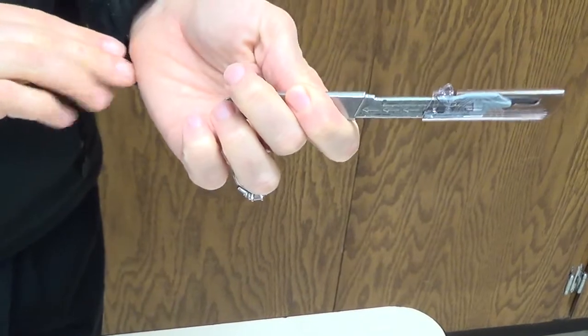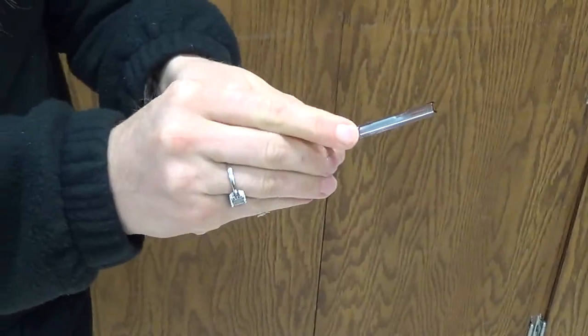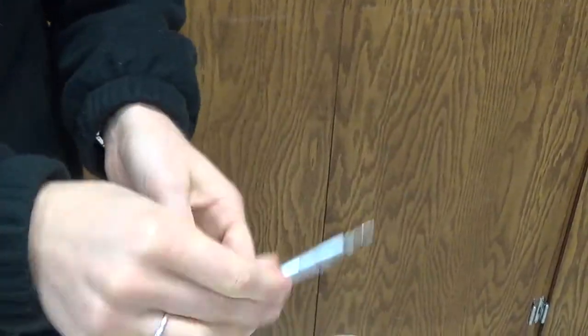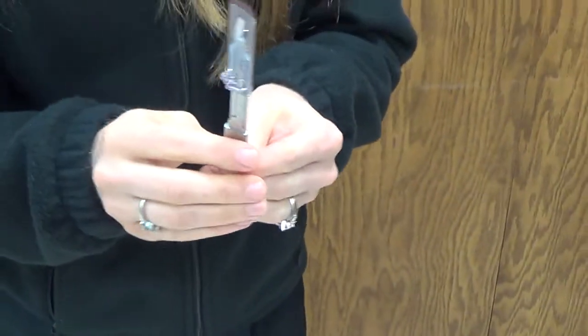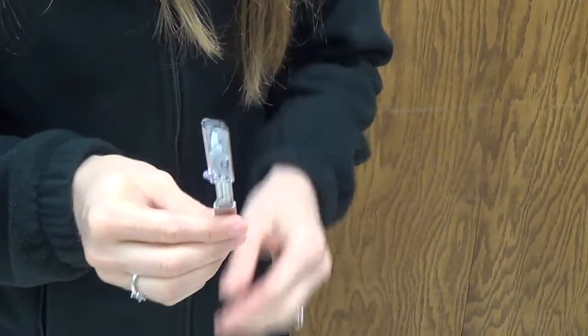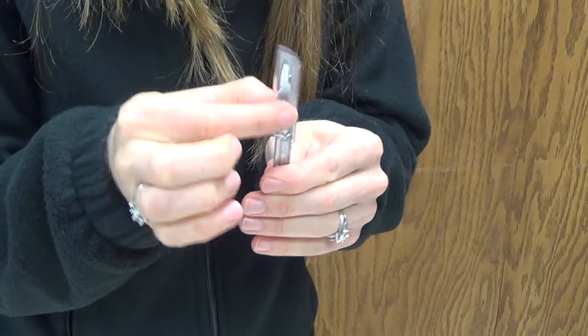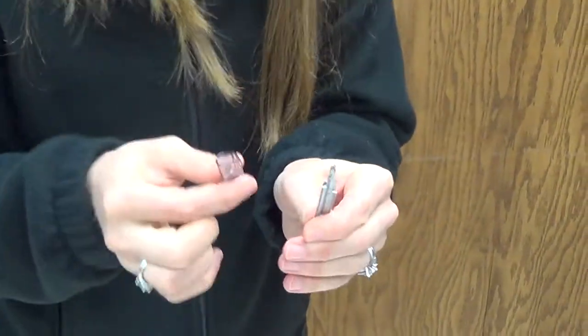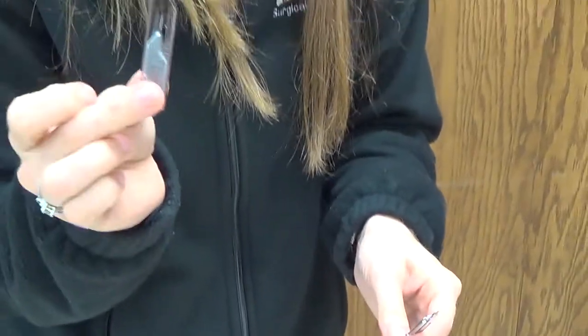Now the idea behind these is that you're supposed to hand them up to the surgeon with that blade covered. They're supposed to open it up, make their incision, and then cover it back up before they hand it back to you as the surgical technologist, so that that blade is covered at all times so it wasn't able to cause any type of a sharps injury. To take the blade off, you just grab right at these serrations here on the blade and then pull it straight off. And then we would dispose of that in a sharps container. Even though it's protected, we still treat it like a sharp.